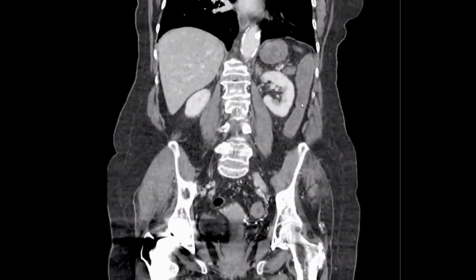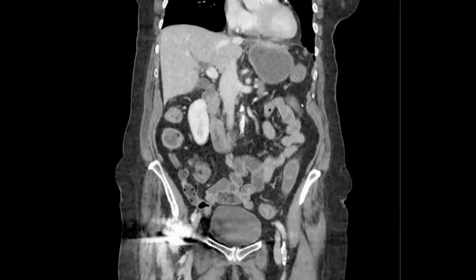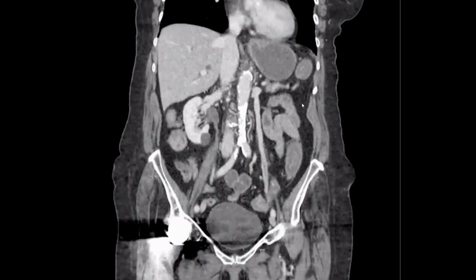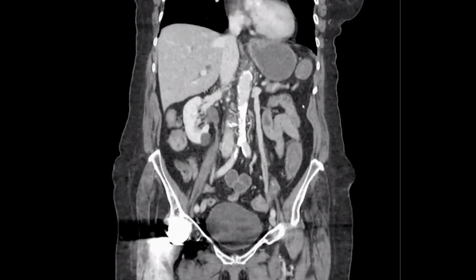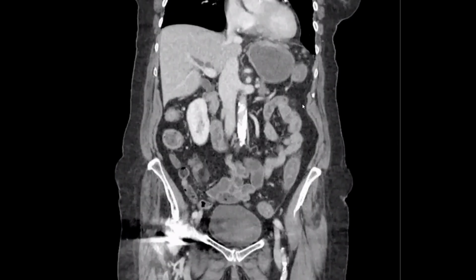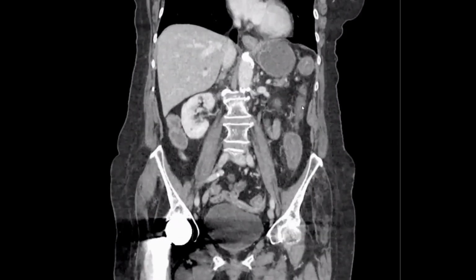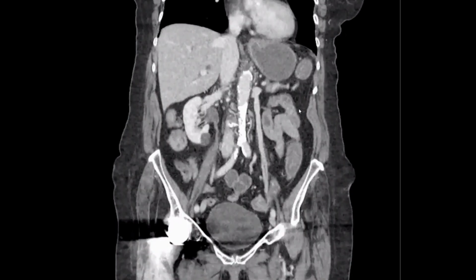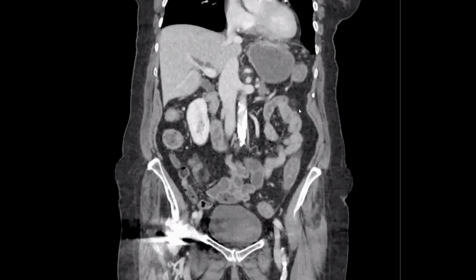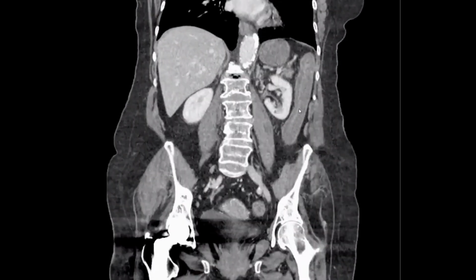It's hypoenhancing. Do you agree? Yes. Okay. What's your definition? You said we have an inflammatory process. Colitis, inflammatory. So this might be ulcerative colitis, maybe in the acute phase. Okay, what else? Maybe ischemic colitis, but I can't see that. Ischemic colitis, is that matching?